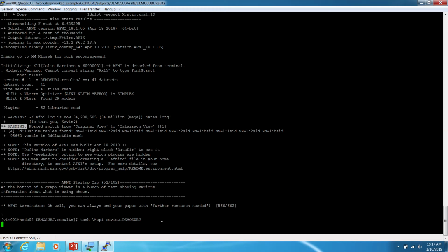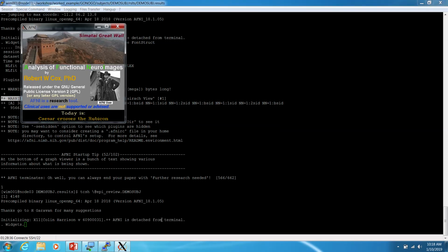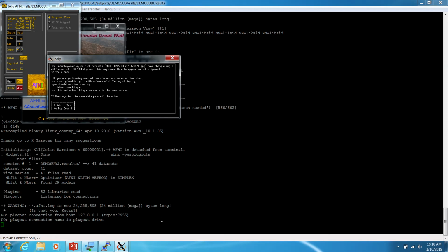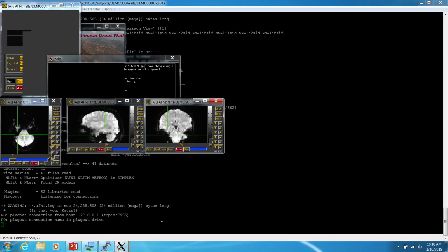So let me go ahead and start this so it's less abstract here. It's similar to what we were doing before in that there'll be an OK button and you'll step through them. Right now it'll just load up AFNI, and then it's going to say, hey, this is a pair of data sets.